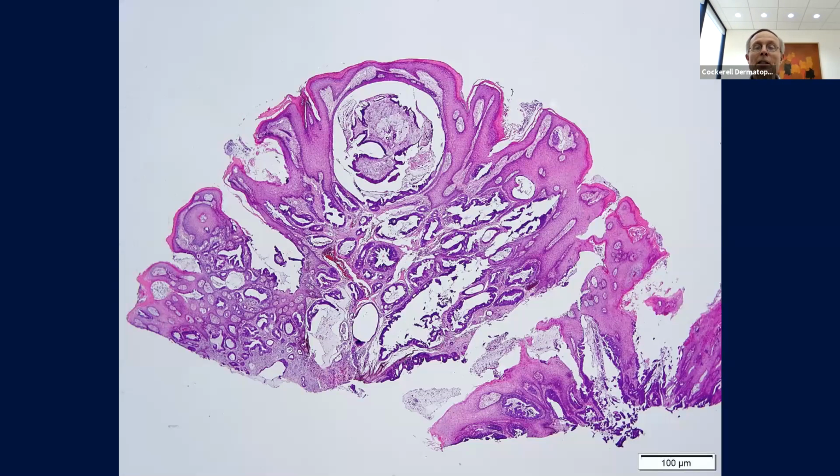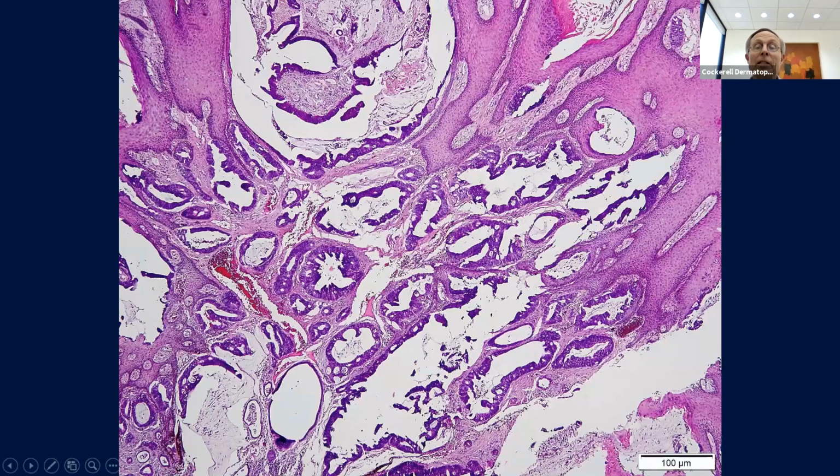Okay, different situation, interesting neoplastic process. We've got a shave biopsy of, again, another verrucous lesion. So pretty warty. So we've seen several warty things this morning, but here we've got some other stuff in here that isn't a wart. So you've got these atypical basophilic cells in here. As you go to higher magnification, they're forming glands. There are glands in here.